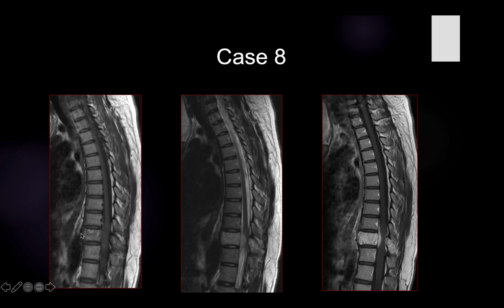And if we see here in the T1 weighted images, the region is showing some signal that is high in T1 weighted images, and again this is one of the characteristics for vertebral hemangioma. This is a type of vertebral hemangioma called aggressive vertebral hemangioma. This vertebral hemangioma is usually associated with an extraosseous soft tissue component like this, and also involving the body and also the spinous process or the posterior neural element.